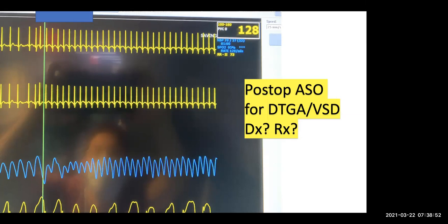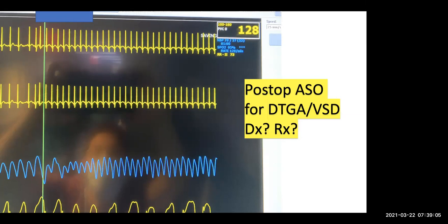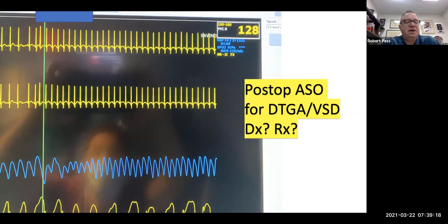Yeah. So looking at the tachycardia strip, I see P waves for every QRS, and they're before the QRSs. But looking at the P wave on this side versus the P wave just before it started, it looks a little bit different in morphology. So I'm tempted to think that this might be some sort of EAT. Right.